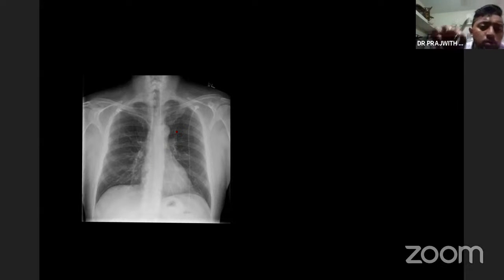Now one more thing we have to observe is the ribs. This is the first rib, then comes the second rib. If you observe clearly, this is one part of the rib, and another part of the rib is coming like this. This part of the rib ends only here; it is not reaching the midline, whereas the posterior part is almost reaching the midline.